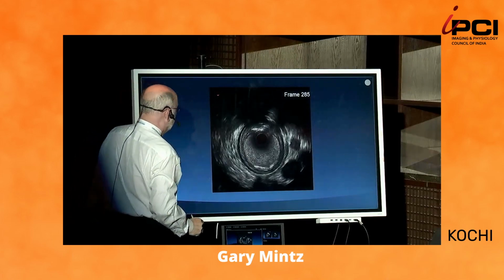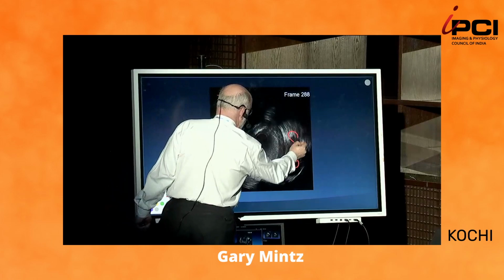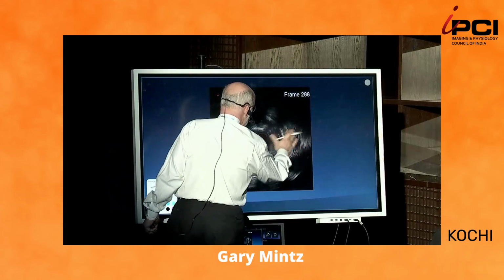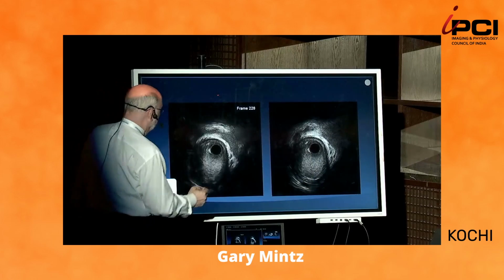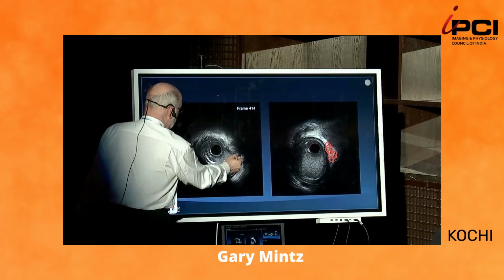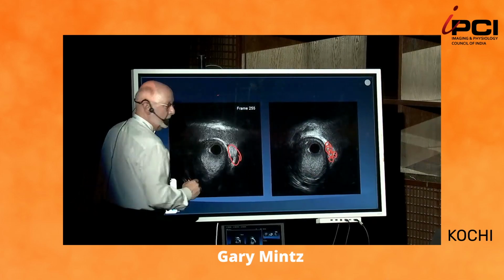So here's an example. These are veins. And these. They don't connect with the main vessel. Okay? And here's an example of vasovasorum. These things are vasovasorum. You can see them here. Okay?